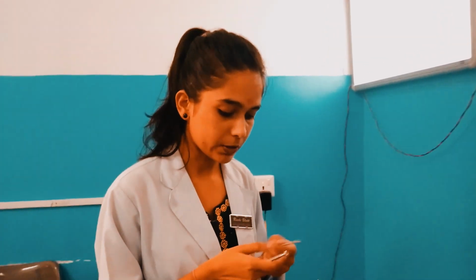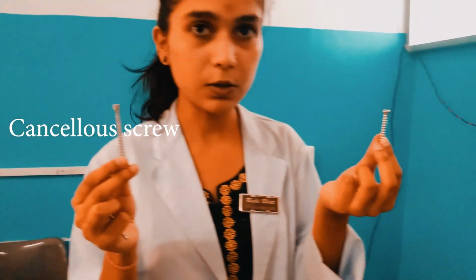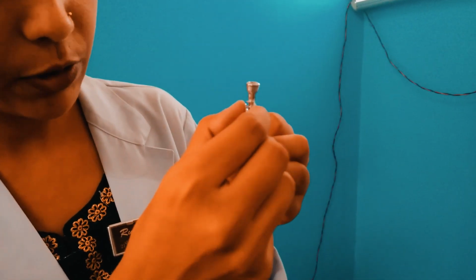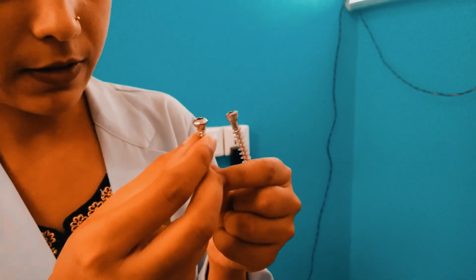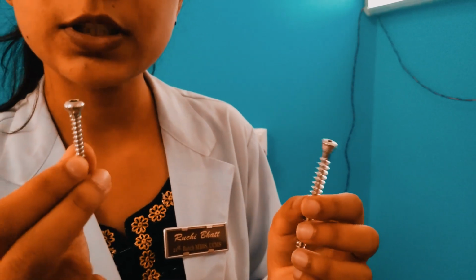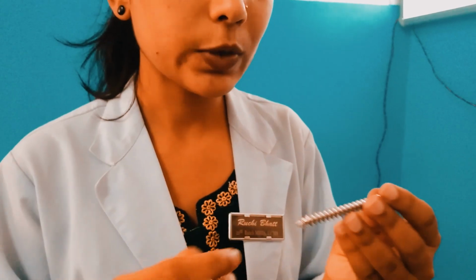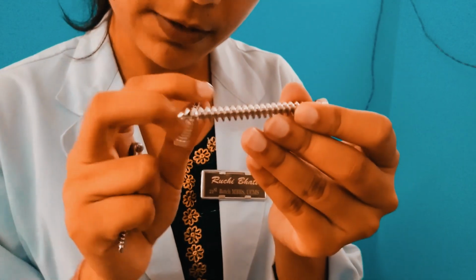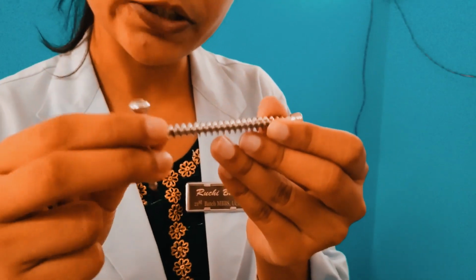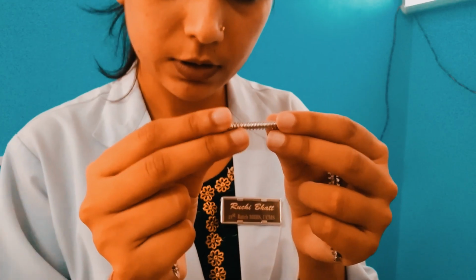Let's talk about the cortical and cancellous screw comparatively. This is our cancellous screw and this is our cortical screw. In the cancellous screw, the thread diameter is comparatively larger than the thread diameter of the cortical screw. Whereas in the cortical screw, the thread diameter is less and the core diameter is more in comparison to the cancellous screw. Also, we can look at the thread depth. The depth between the thread and the core is known as thread depth, and it is more in the cancellous screw and less in the cortical screw.